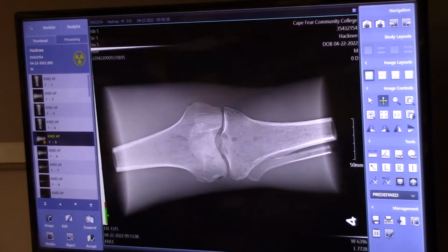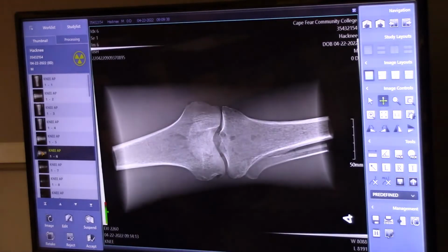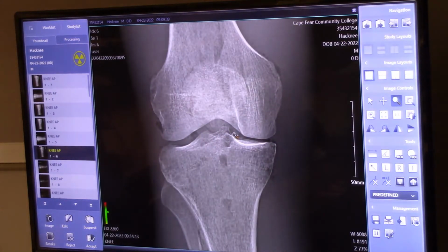Okay, now what do we do for the next one? This is the same one again, so forget that. Now we're at 2260, so our target number must be around 2,000, because here we're a little bit above, and here we're a little bit below. Okay, so 2260 is our exposure index. How does our image look? Looks nice, doesn't it? Okay, I'm liking this.